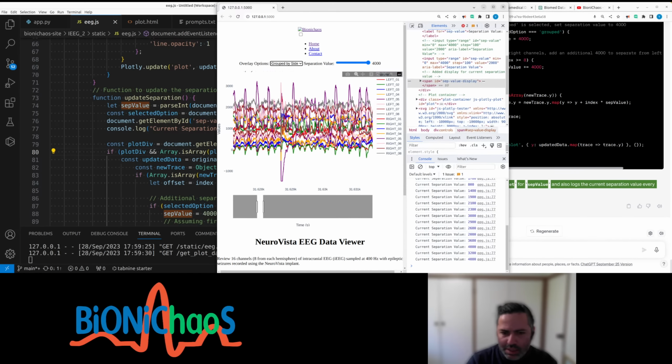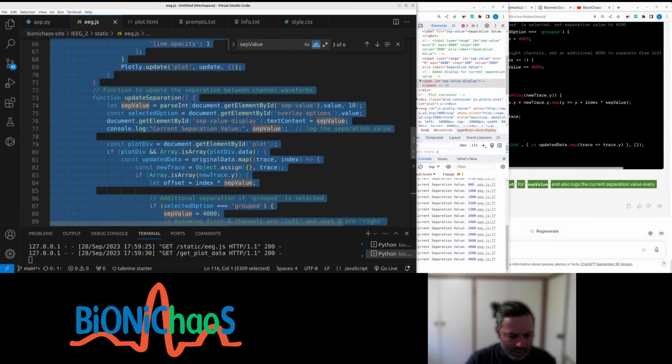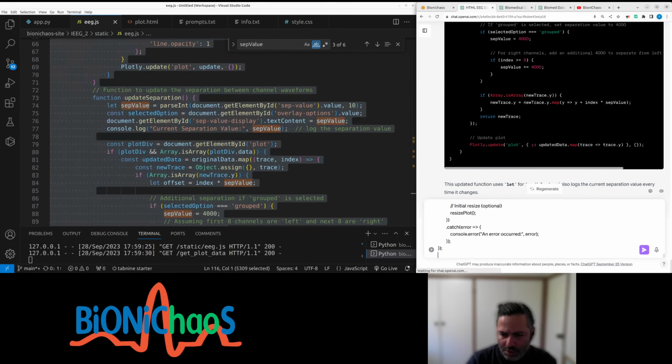And group by side. Pop this. The group by side doesn't behave as expected. Also, the colors, can we make sure the colors use the preset color scheme all the time?